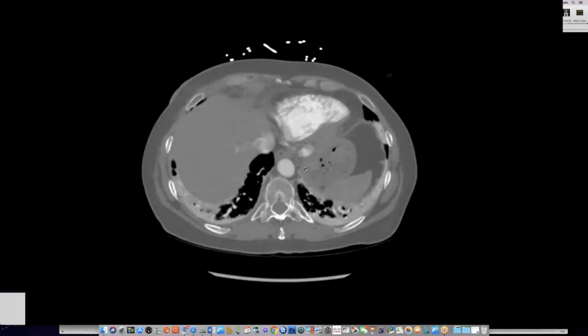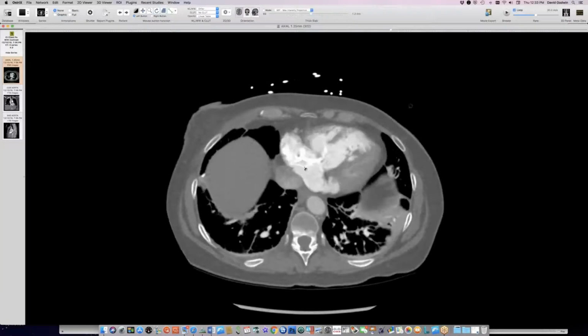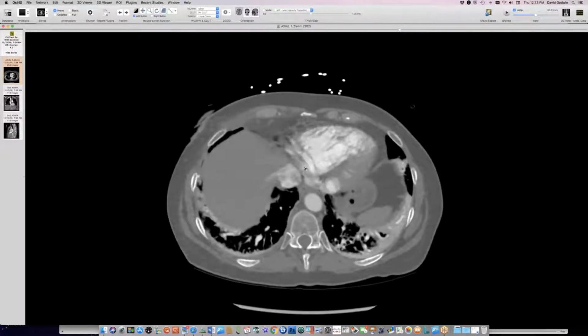You definitely have some pretty severe pulmonary hypertension, and so the right atrial pressures must be very high. I don't know if that has anything to do with it, but it probably makes it at least more conspicuous. So at least that's how I would interpret it. I don't know if that's right or not. We won't dignify it with aneurysm, but we'll say it's dilated and it probably reflects the high pressure.